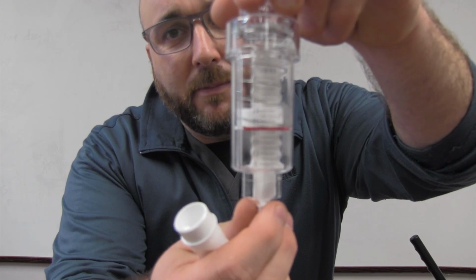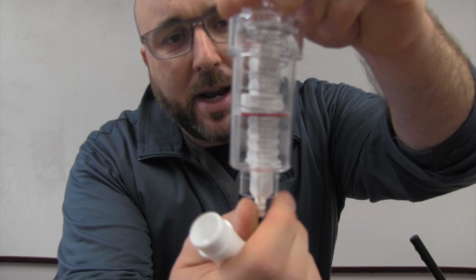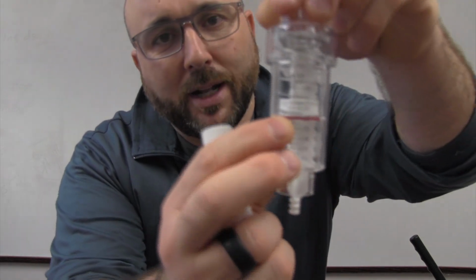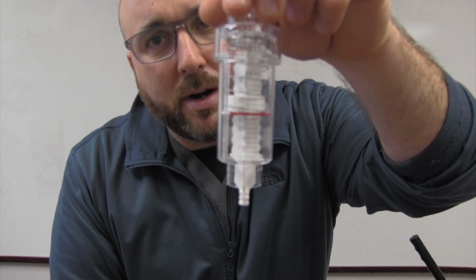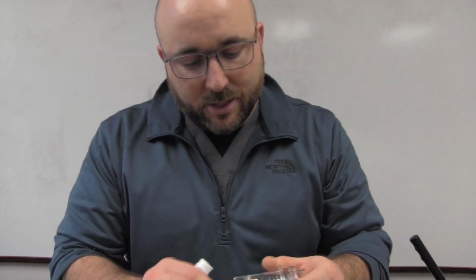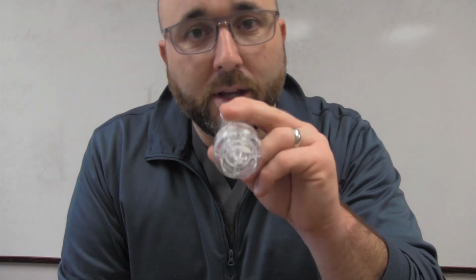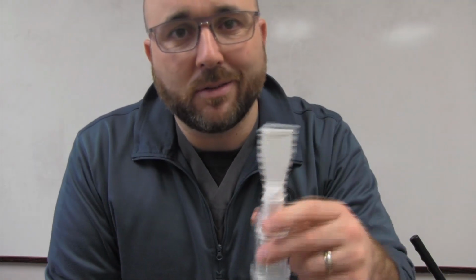Now I'm going to show you a little bit about it. It's got numbers on there, and what we can actually do is turn this aspect right here to increase. So right now at the red line we're about 27 centimeters of water pressure. That is what the pressure is going to break off at when we take our breath in. So let's just start low. I'll start at 17, put the mouthpiece on. You're going to watch, I can blow through this all day long. There's nothing really going on with blowing through it. But when you inspire, it's going to pull a valve against you, and then once you hit that pressure, it's going to let air come in.